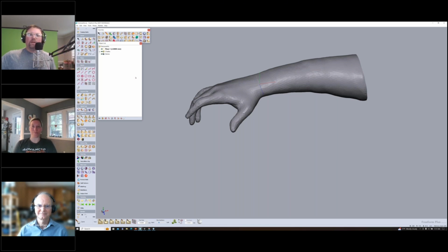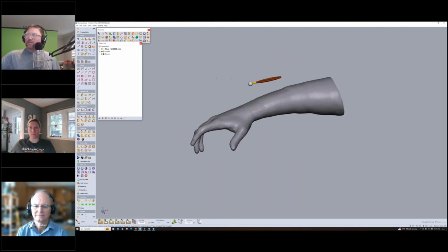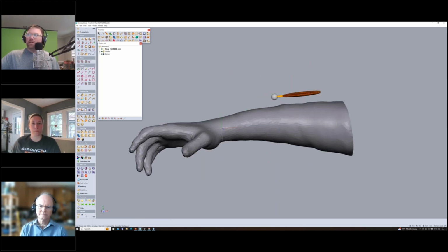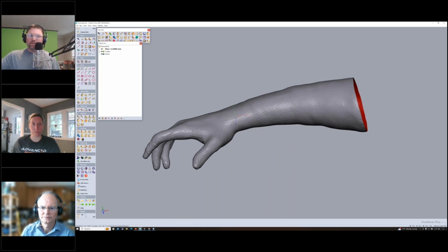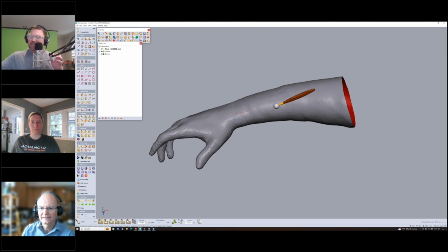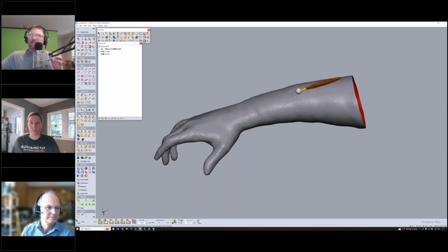what we're talking about. But the neat thing also about Freeform is, so we've got a scan that has come in. Just for the sake of speed, I went ahead and aligned it to the origin, and it is fairly cleaned up. But what I didn't do is, you can see that there's lumps and bumps that we're going to want to get rid of. We don't want to print those lumps and bumps in. They don't belong to the patient. It's just artifacts of the scanning process itself. Not a typically great scan, but this is absolutely fine, and it's an easy scan to work with.